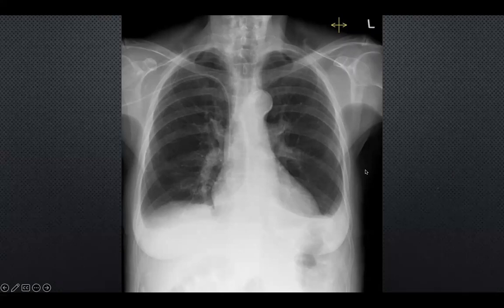Potentially, yes, potentially. So with cardiomegaly, you're always measuring the cardiothoracic ratio. And you can only really measure that on a PA radiograph. So making sure that they're standing and there's no distortion of the mediastinum, and there's not too much rotation. There isn't too much rotation on this, which is great. The cardiothoracic ratio here, I haven't got a measuring tool, but if you ballpark it, it's probably going to be just about 50%. Anything over 50% would be cardiomegaly. So this could be on the upper border of normal in terms of heart size.